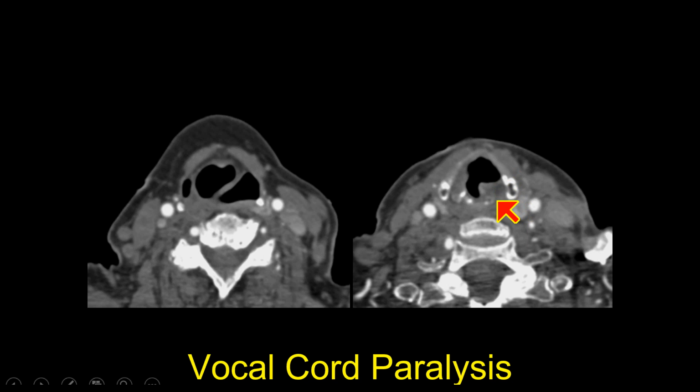The secondary signs are widening of the thyroarytenoid groove, the space between the thyroid cartilage and the arytenoid. We have anteromedialization or thickening of the aryepiglottic fold, and we have prominence of the piriform sinus, along with asymmetry of the arytenoids. Those are all the secondary signs of a cord paralysis.